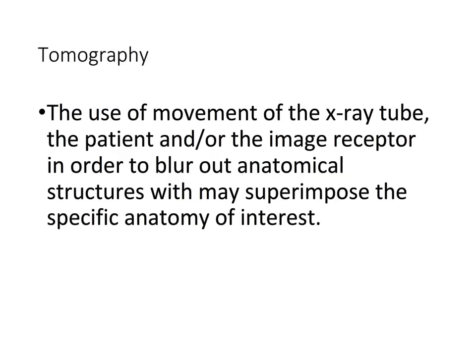In this video, we will review tomographic equipment. Although tomograms have been mostly replaced with computed tomography, some tomographic images are still performed in the radiography department today.